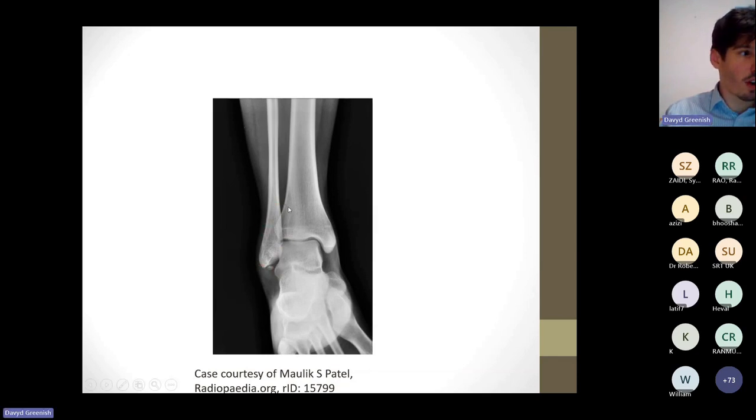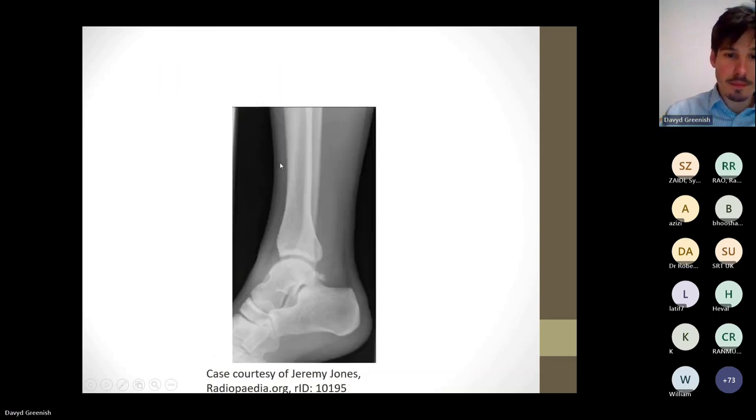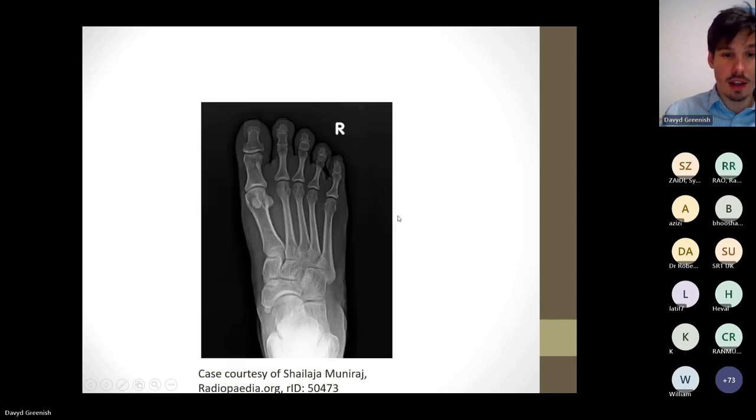So that's an os subfibulare. Very nice. This is the one that people normally come across a few times before. This is the one that's probably got slightly more clinical relevance. An ossicle sat in the posterior aspect there, os trigonum. Really good. And this, I believe, is the very last one.